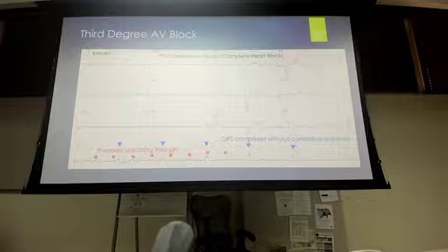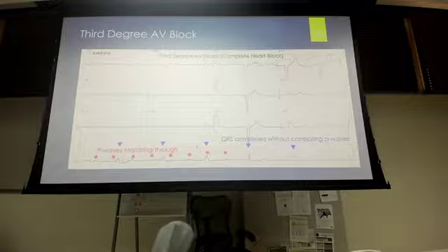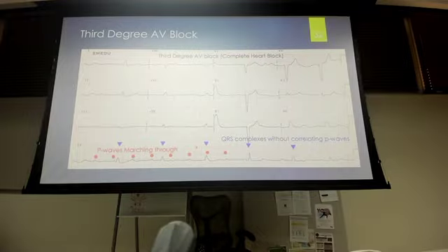But sometimes when you have such a significant issue with the heart, you're not necessarily going to see some of those normal waves. Doesn't mean that repolarization isn't happening, because obviously it is, because we're getting another depolarization, but you're not going to be able to see that all the time. Sometimes it'll eke out a little bit, but if you look up here, you've got your QRS complex here, and what is this up here? Well, that's your T wave there. You just can't see it in lead 2. So you've got a T wave up here.